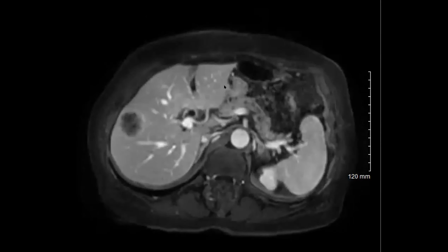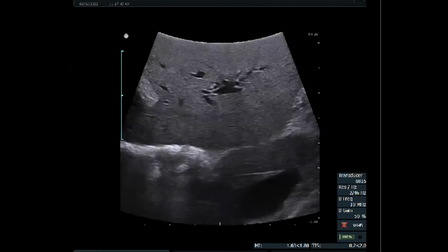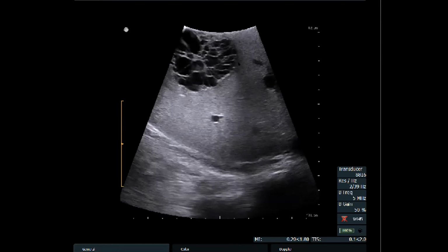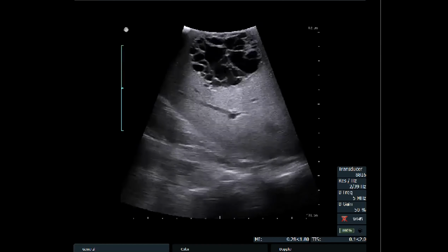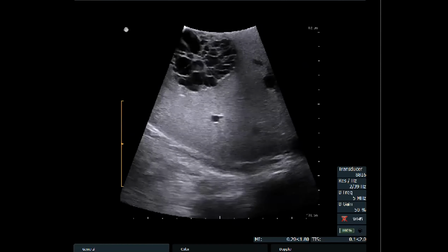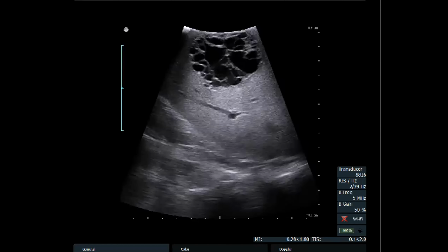Sure. So then let me show you an ultrasound. They went to surgery, rightly so. And here is an intra-op ultrasound, which has a very interesting look. If you remove this and put this in the ovary or some other part of the body, a kind of Echinococcus, that's one good thought. But as you get, these thin septations are all over. Echinococcus can present in any way, but more commonly you have daughter cysts that are distributed uniformly in the periphery, and so on and so forth. Yes, that's a good thought. Anything else?